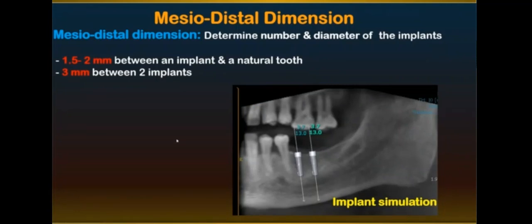Is it possible to make a prosthetic planning suitable with this case or not? So I'm not strict with these numbers, because, for example, if I have 2 neighboring premolars, the distance between them is going to be different than 2 neighboring molars, or a molar next to a premolar. Each case has its own agenda.